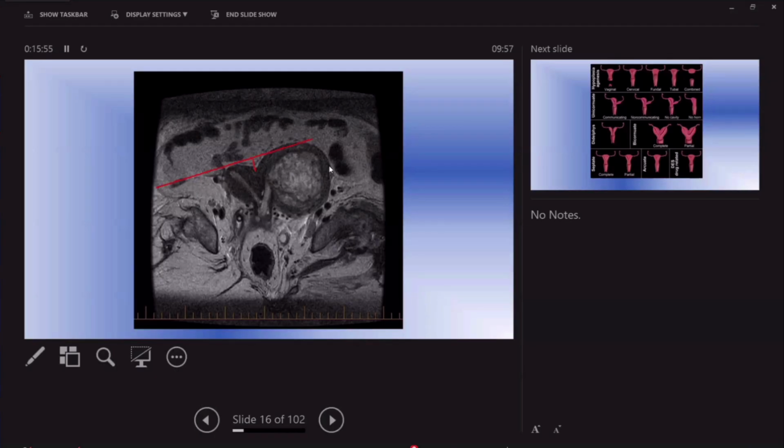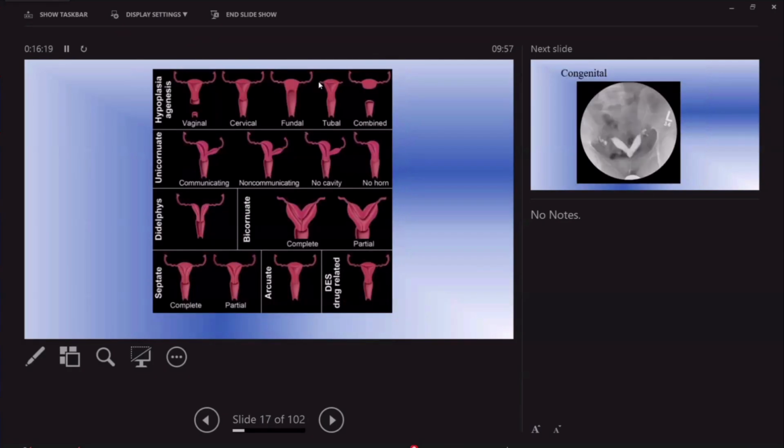If this lesion is strongly enhancing, I would think that I am dealing with an endometrial polyp. However, underlying malignancy cannot be ruled out, because of the presence of these areas of intermediate to low signal intensity within the lesion. So my next step, I would refer the patient to gynecology for biopsy and correlation with pathology to be sure that there is no underlying malignancy.